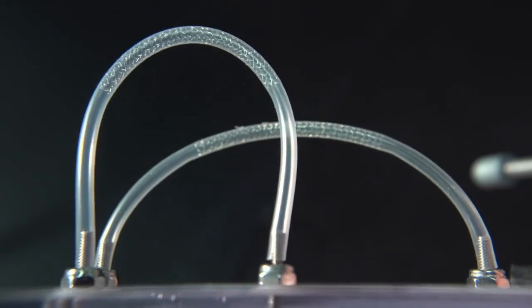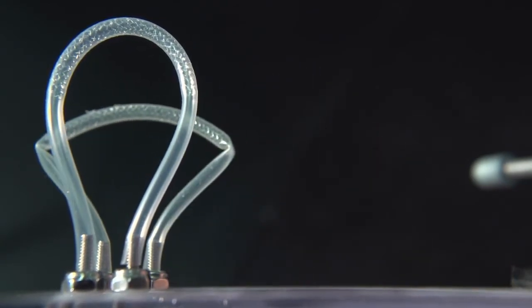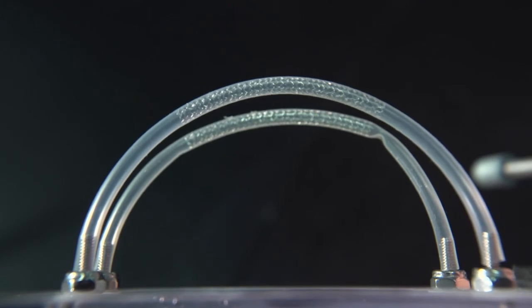Here's a great example of the importance of having a flexible stent design, especially when you start talking about long stents like 48 millimeters. In this video, you will see a Synergy 48 millimeter stent and a Xience 48 millimeter stent. And notice the edges of the stent and the vessel hinge that's created by the stiffer Xience stent.